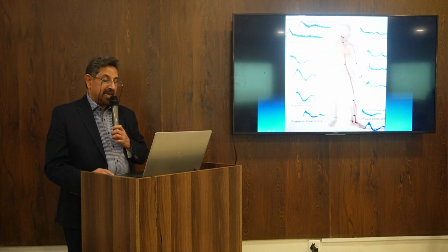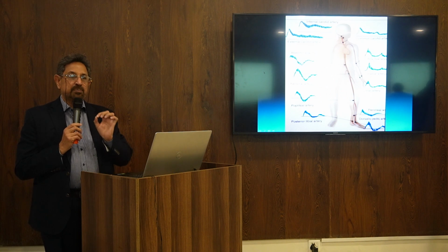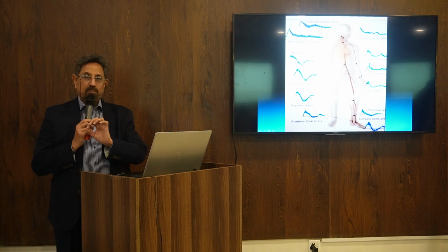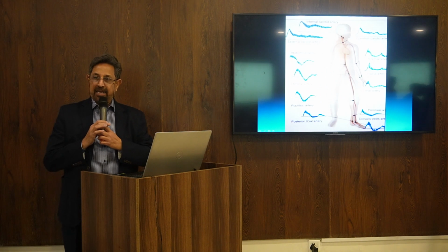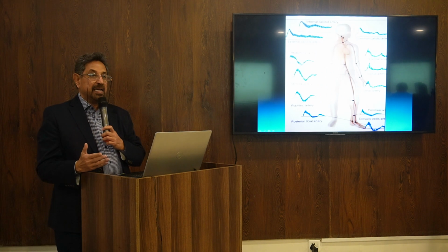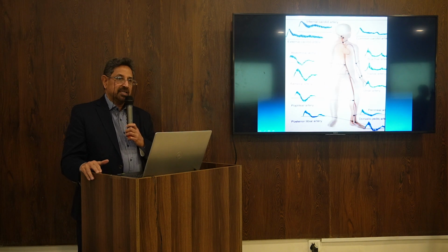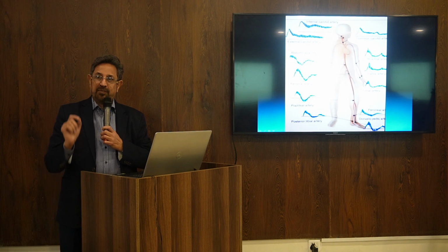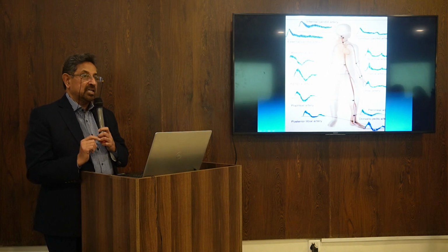This is a spectrum. Every vessel in the body, from head to toe, has its own specific Doppler signature. Whether the middle name is changed, first name is changed, or surname is changed, we will diagnose immediately. As a banker sees the signature and tells that it's a fake, in the same manner we will come to know that there is a departure from normality. This is not normal, but we have to first recognize the normal signature of every vessel. If you recognize the normal signature of every vessel, you will immediately come to know.